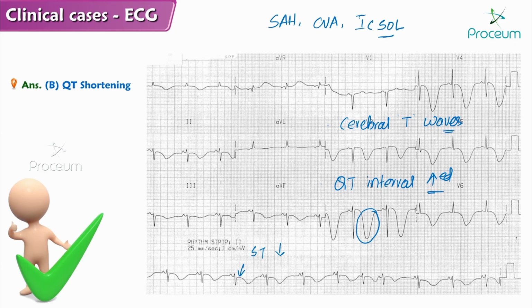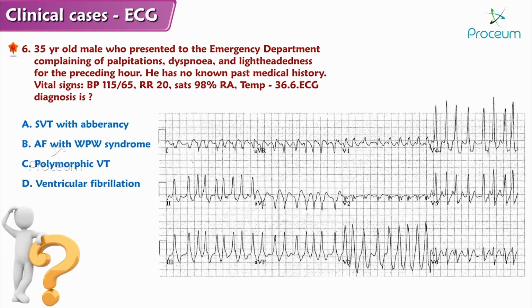Alright. Now we will move on to the next question. Right. So this is another important clinical scenario. I have a 35-year-old male who presented to the emergency department complaining of palpitations, dyspnea, and lightheadedness for the preceding hour. He has no known past medical history.